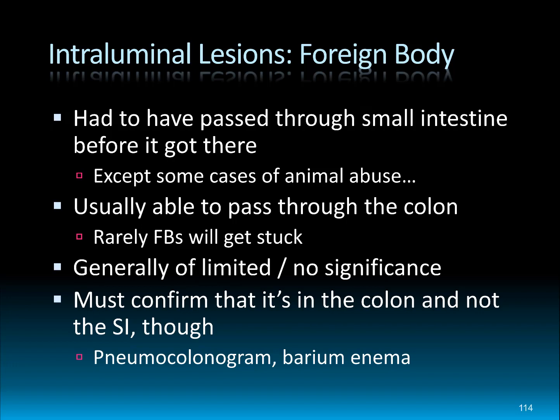Occasionally we do see foreign objects in the colon. Usually they're not of any clinical consequence because they had to get all the way through the stomach, through the pylorus, through the small intestine just to get to the colon, and the colon has a little bit more room to work with. So most of the time foreign objects that get to the colon will end up passing uneventfully. Every now and then, though, one will get stuck, so you can't 100% assume that all will be okay.